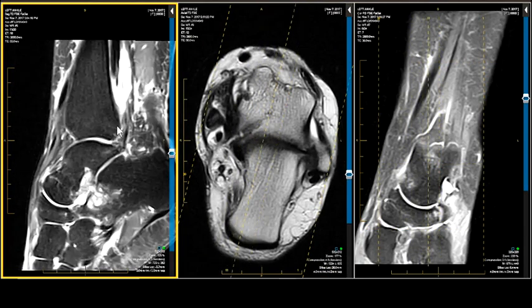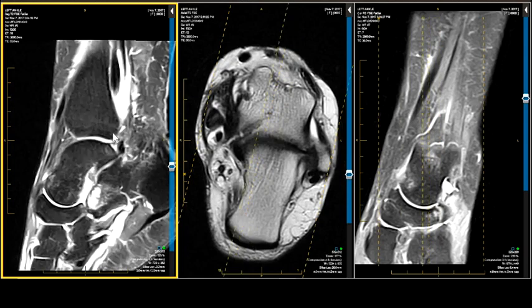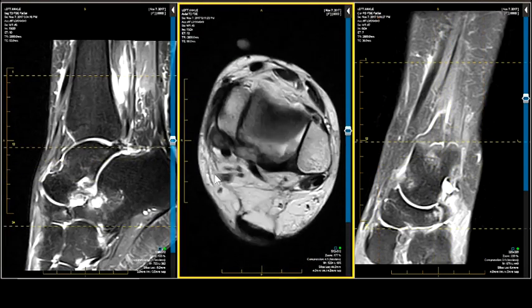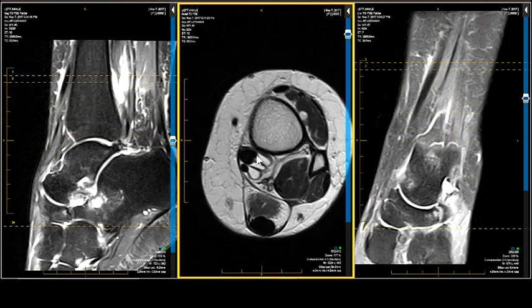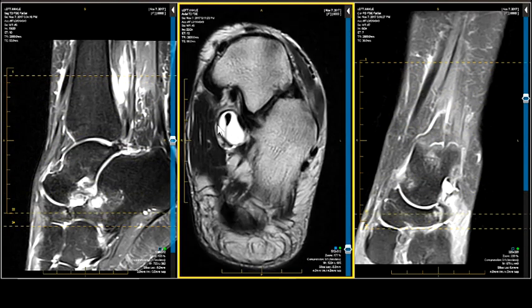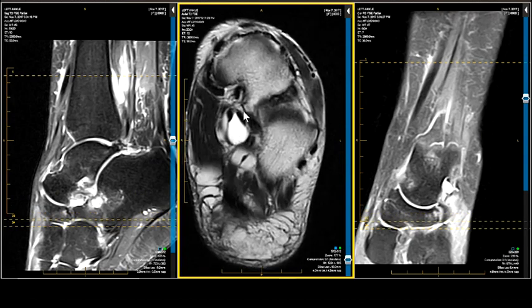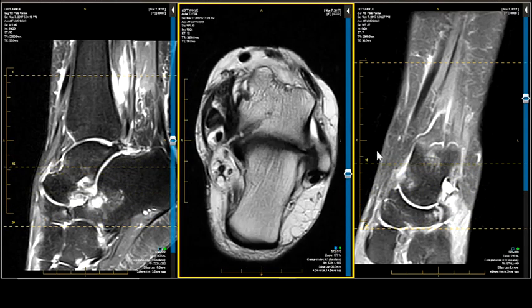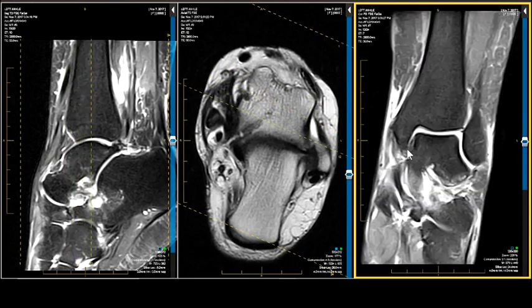There's quite a bit of fluid. The fluid is in the subtalar space. There are erosions in the subtalar space. There is fluid tracking proximally. And there's fluid tracking distally, too, producing a pseudomass at Henry's master knot, where the flexor hallucis and digitorum meet and become friends. They're kissing. Okay, I'll give you all that. I'll give you the ankle effusion.